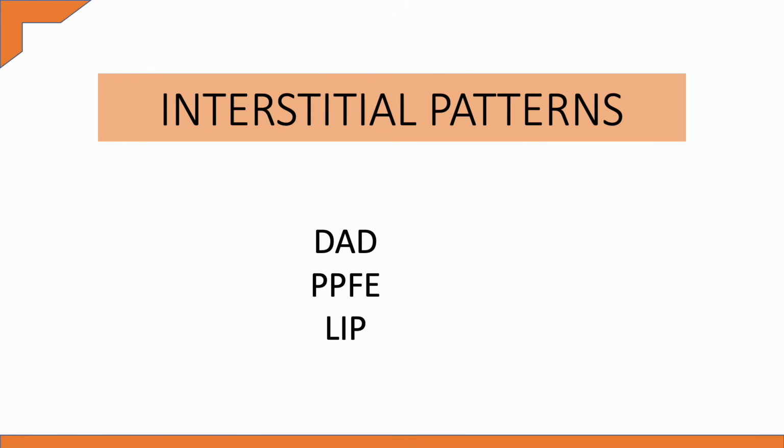This is part 2 of the Glossary of ILD series, where I have talked about the typical patterns of various IIPs on radiology and histopathology, taken directly from the ERS 2025 guidelines. Because these patterns and images have been described in this guideline paper, all the text and the images that you see in this video are from the article itself.